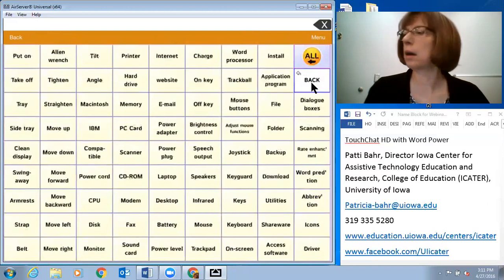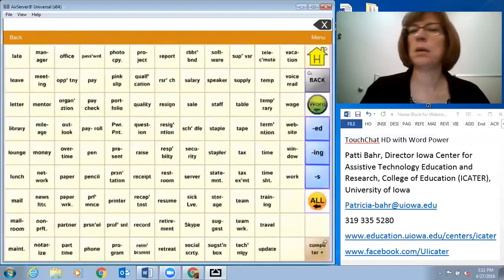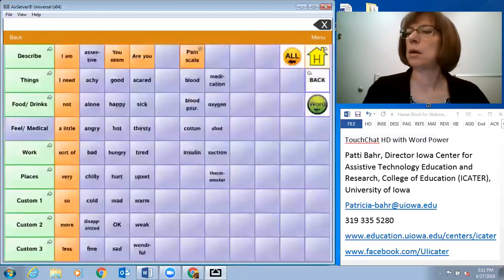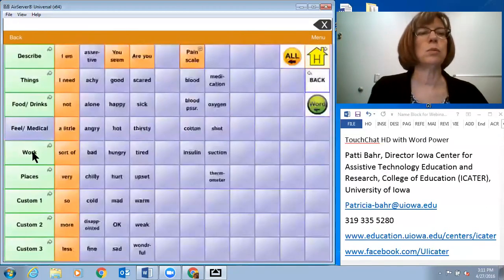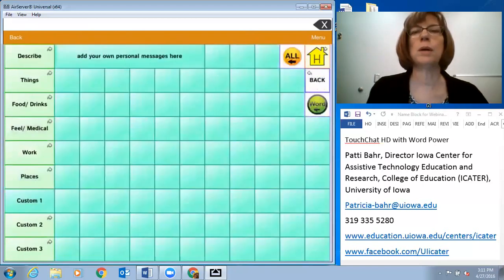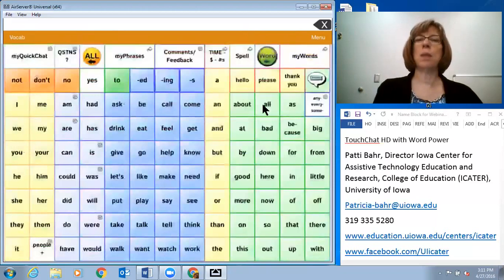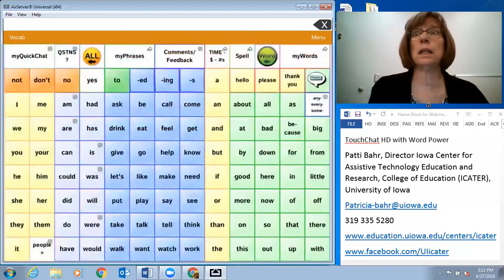I can go back and go back again, back, and I can go back to, I was at work, here's places, here's where you can put in custom things. So we're going to go back to home, and you can just imagine, if you're literate, you could certainly use this and say lots and lots of things.